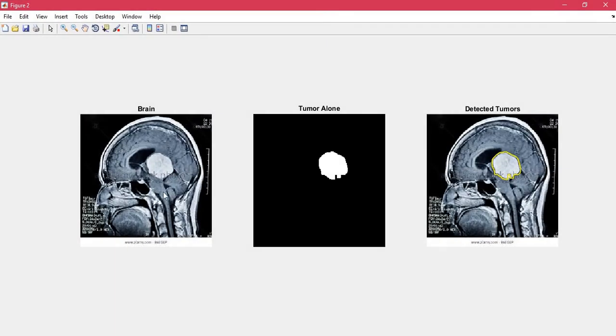Yes, here is the tumor. Yes, here is what I said. That's why I made the dilation. Here is a small 2 or 4 pixels, as I think. Here, not completely dilated, but it's much better than not dilating it.